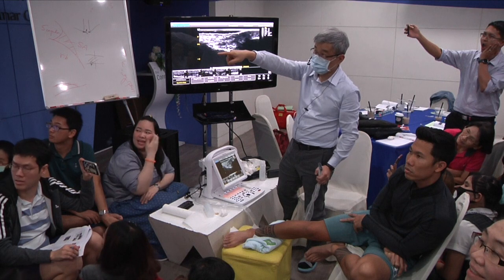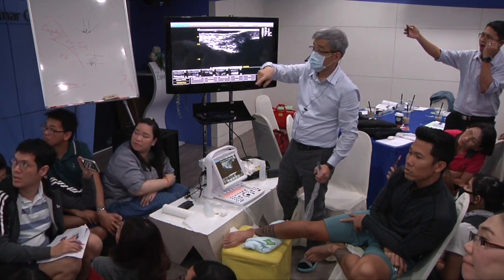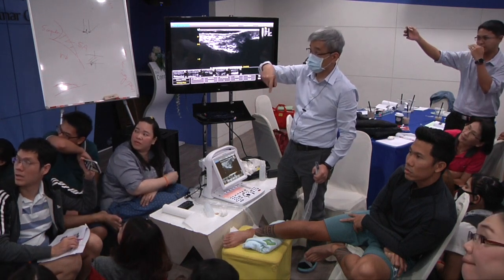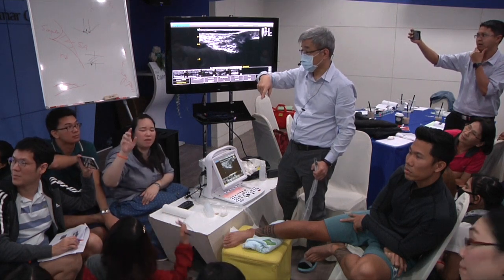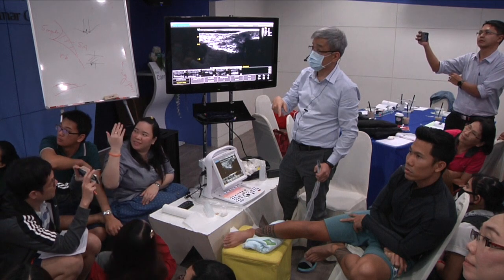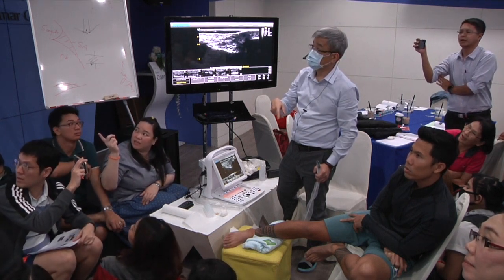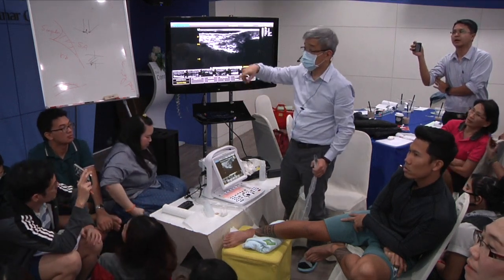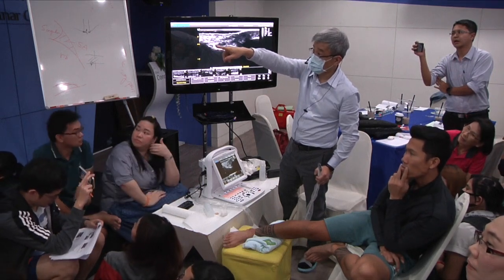The AITFL, we already showed you. Okay, next. This is injury. Next. Oh, no CF. All right, okay. Yeah, very close to the bone. Look at the B. It's very close to the bone.